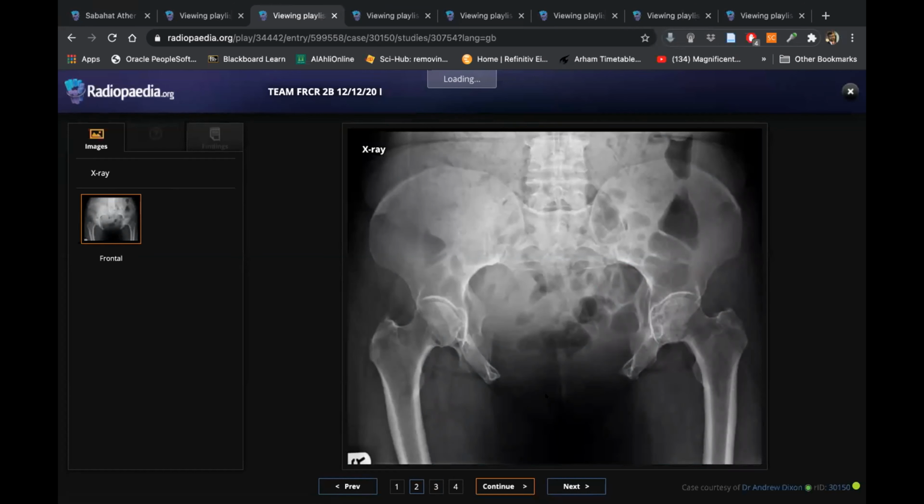Only that, this is because we are thinking, I told you this is chronic. So not urgent referral, but it's a chronic disease, and it can be managed accordingly. And this is, as they described, osteoarthritic changes. Osteoarthritis. The association I was asking from you was the OEIS complex: omphalocele, exstrophy, imperforate anus, spinal anomalies. But these additional questions, the examiner always asks to give you bonus marks. As long as you are describing the findings correctly, it's good. So we should never stress when we fail to answer the secondary questions. Just concentrate on the next case. It would be fine. Okay.